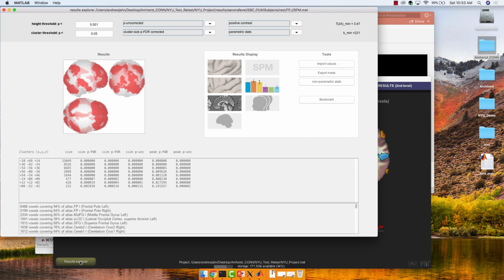So this is your typical glass brain that you would see here. For these connectivity maps, this isn't looking at any of the graph theory yet. We'll see that with ROI to ROI, voxel to voxel. But for looking at these simple connectivity maps, you can apply a cluster-based correction to them if you want to. Because we have all these correlation values, we've converted them to z-values, and then we have one in each voxel of the brain. We can see where these clusters are significant.